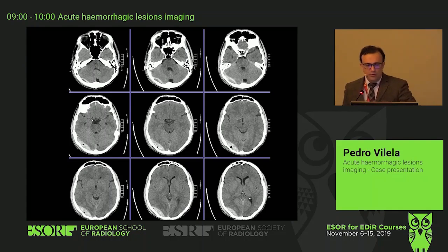Very good. So would you think that we should be concerned regarding this patient on the evolution? Do we have signs that are actually worrisome for us? Yes, because it's an open fracture. Yes, for once. So it needs a different treatment. It has the depression. Because it's most likely an arterial bleed, it can rapidly increase, and so it needs neurosurgical input immediately. And it also has a little bit of a mass effect.